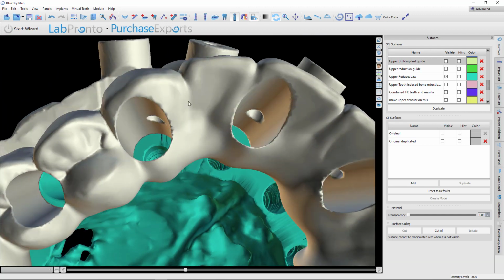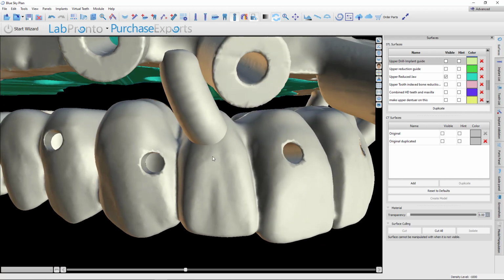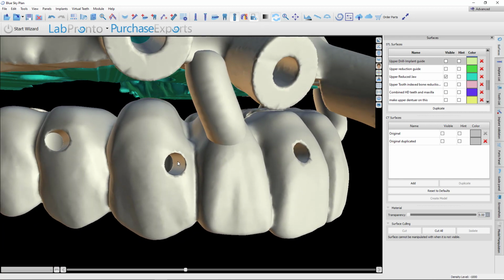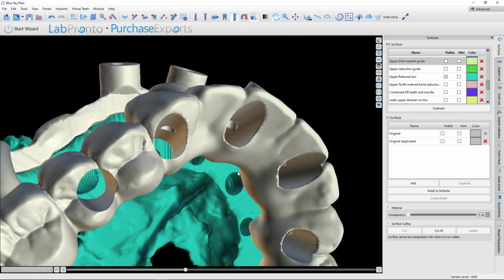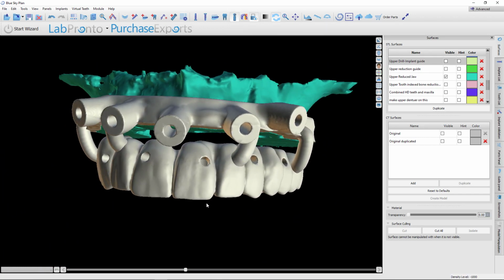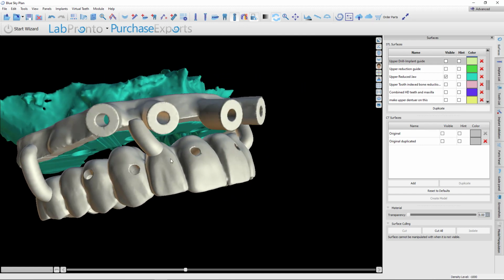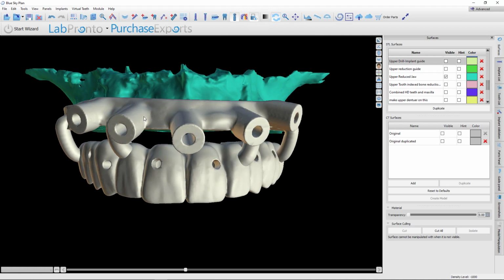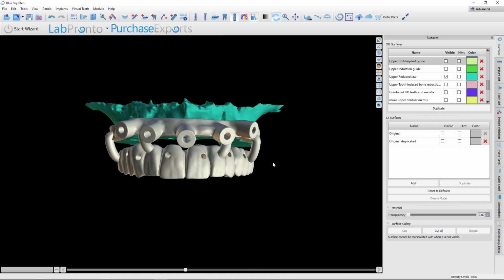So what these are is just little holes. If you fill a syringe with acrylic, then you can literally put the tip of the syringe in here and pump that acrylic in, and it will fill the entire space around your cylinder very quickly and easily. So you can pick everything up all at once. And again, once the pickup is complete, now you could just section here, here, here, and here. Go trim those up with a burr, and this would just be discarded. Its only purpose was to position things properly. So that would be the completed case for the upper arch.